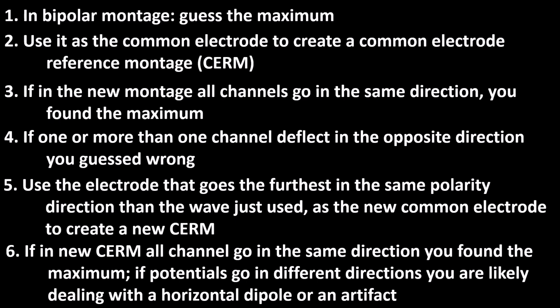I will now show you an example. This frame shows a bipolar longitudinal montage with a few significant electroencephalographic elements. I have highlighted one of them as the likely maximum of the field, but the presence of the elements above casts doubt on the location of the maximum.